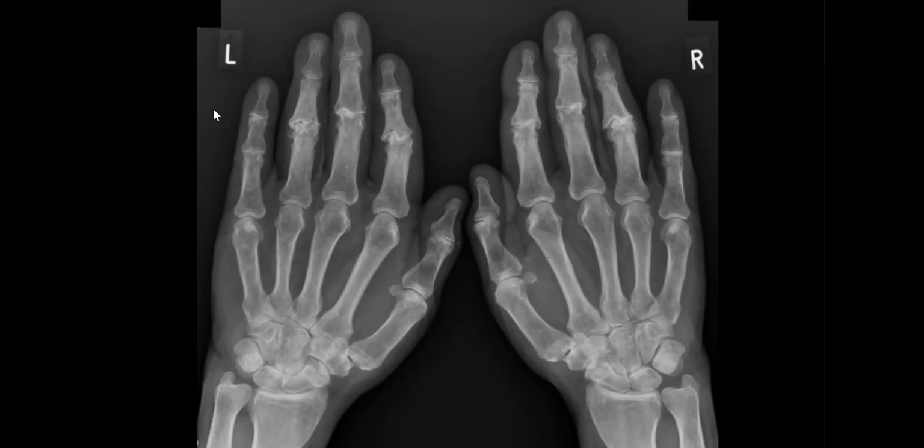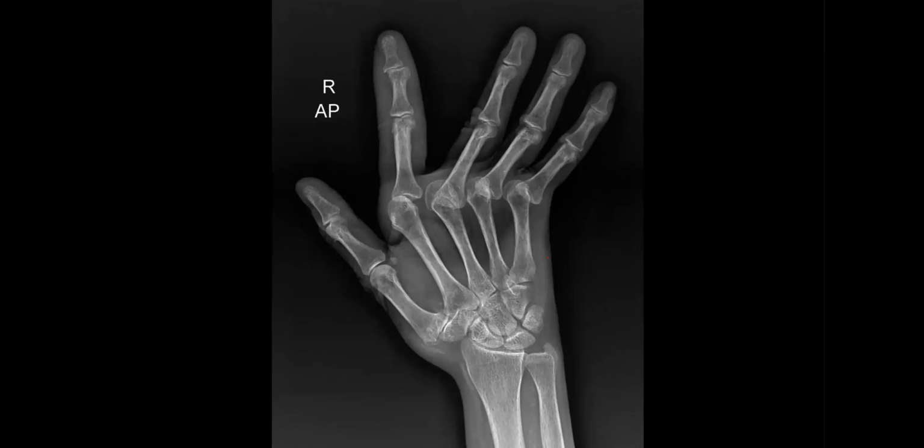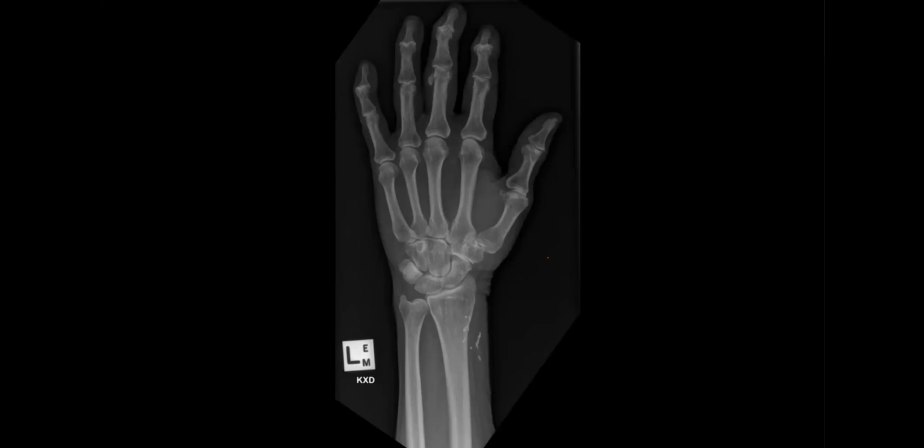And type of patient? Sir, it is like an old patient. Male or female? Mostly female. Okay, postmenopausal female. Very good. I'll give you another case. Yes, this one is the last case.